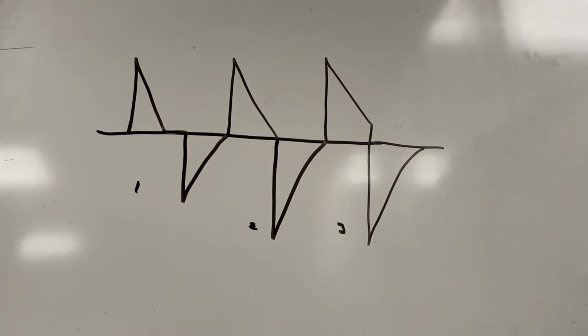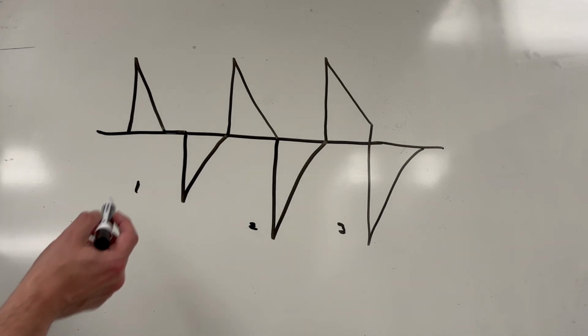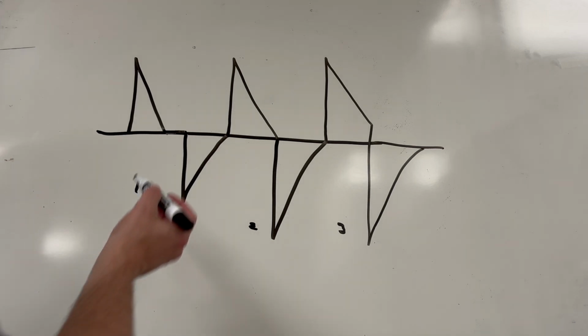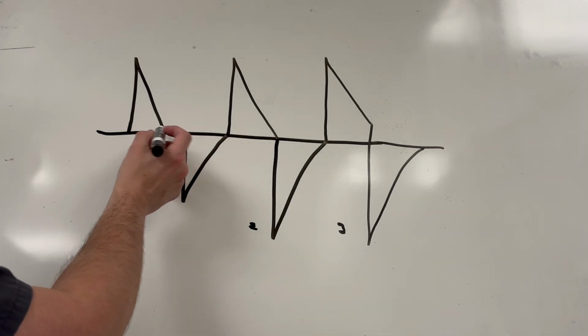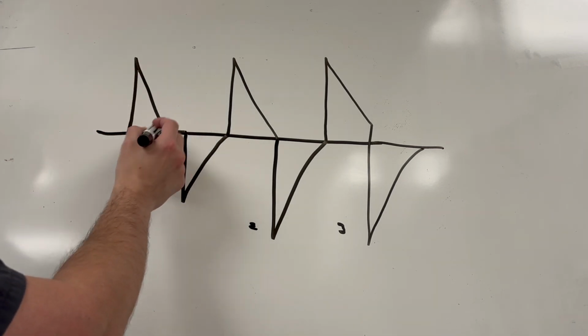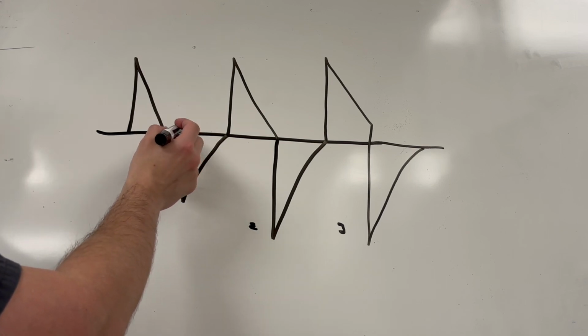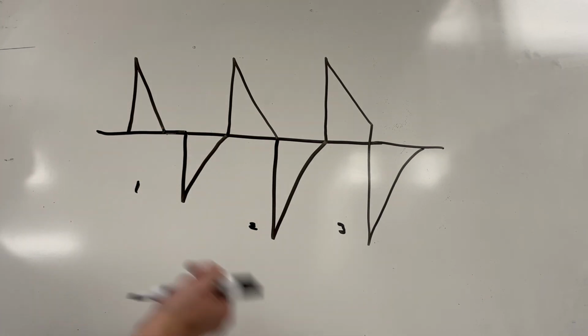You can look at waveforms like this as long as all the settings are the same, and you could trend how they're doing. The sooner that they reach zero flow at these same I-times, the less compliant they are. So in these scenarios, this shot right here, where you go up, down, and we have this inspiratory hold because we reach zero flow so quick, would be your least compliant state of that lung.